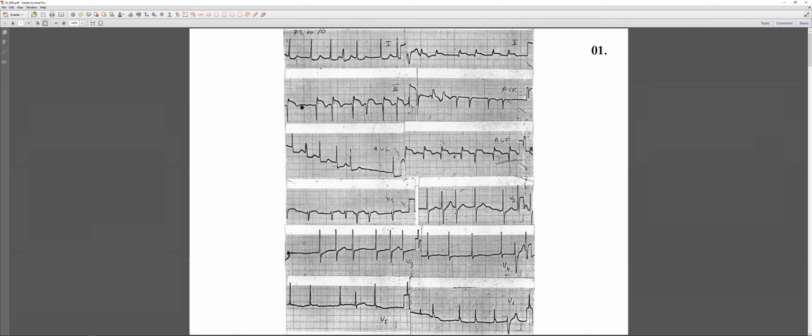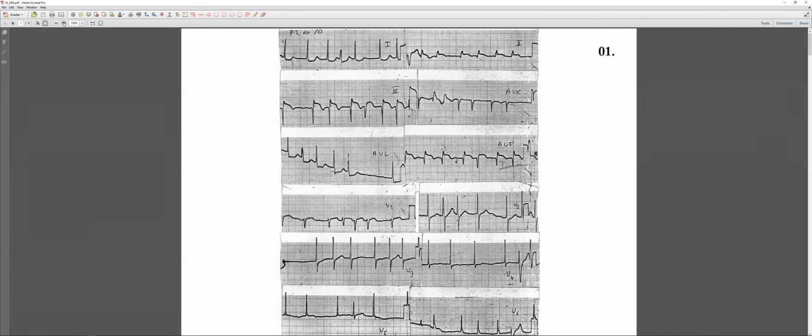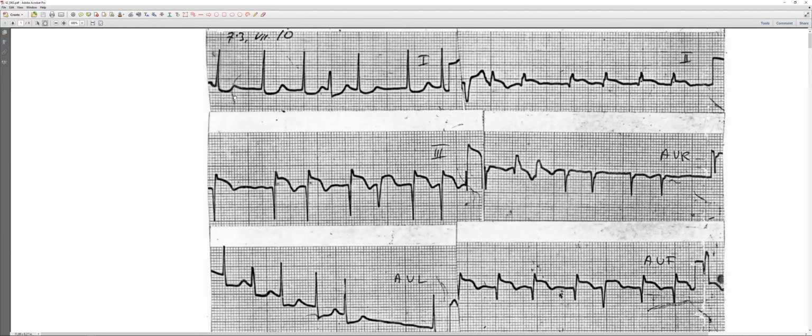I want to zoom in to be able to see the F waves. Yes, but we don't need to see the F waves. This is not how you diagnose atrial fibrillation. That arrhythmia, no P wave, enough. When they apply a high pass filter, it makes the baseline a completely straight line. Here it is not, but it's okay.